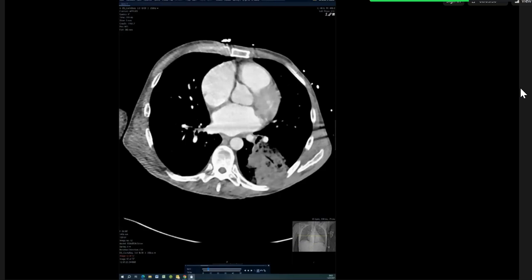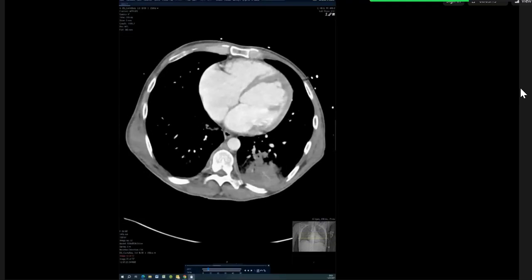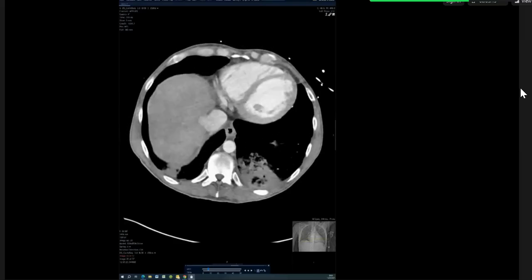And in a patient with heart failure, I would be worried about thromboembolic causes, such as atrial fibrillation or an irregular heart rhythm. I would interrogate the heart to exclude atrial septal defects or any other abnormality, but I can't appreciate that.